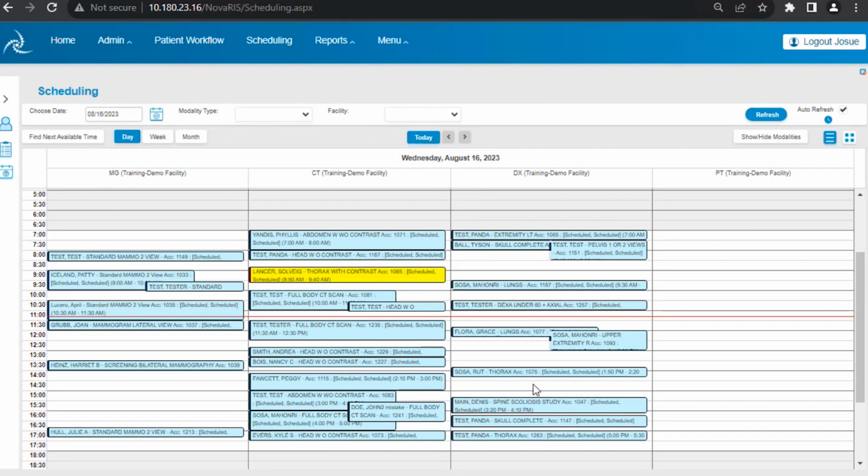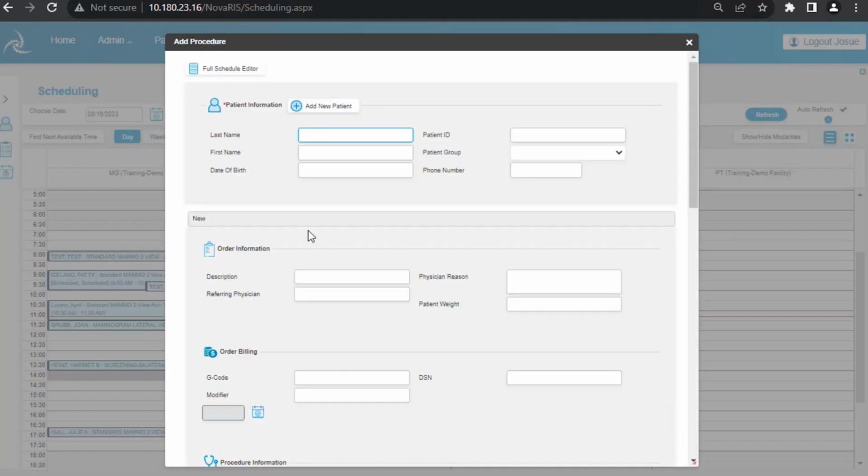So the same way, sometimes what happens is you might want to quickly schedule patients. So one of the other solutions that could have is what happens if I have a patient that I need, but for some reason that specific doctor that is telling me to schedule a specific procedure might be asking for a specific additional information that we normally don't do in our procedures. So those are some of the things that could happen.